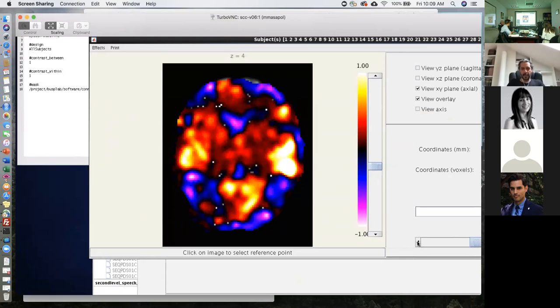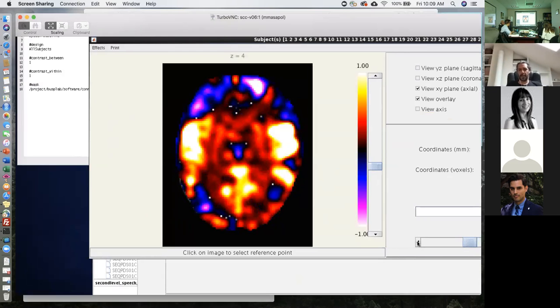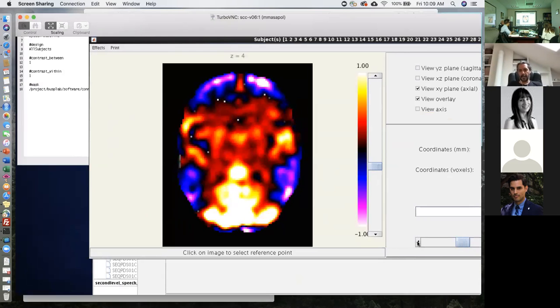But in the raw data, why would that be? Why would the raw data be different? Well, because the raw data has been masked already, so there is an implicit mask that is acting upon the raw data, and it's removing regions that are considered outside of the brain. And let me just browse through the data. Let me see if I can decontrol the screen for a second and browse through the data quickly to show you what I mean there.